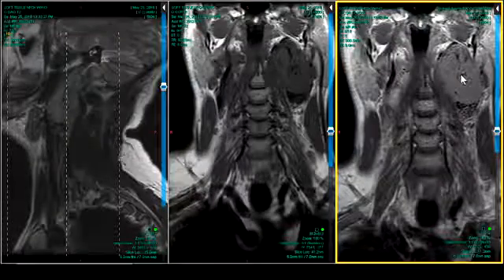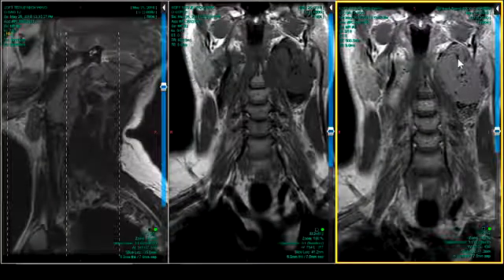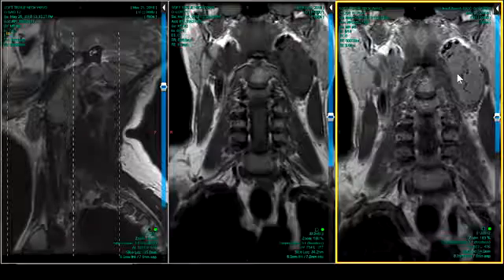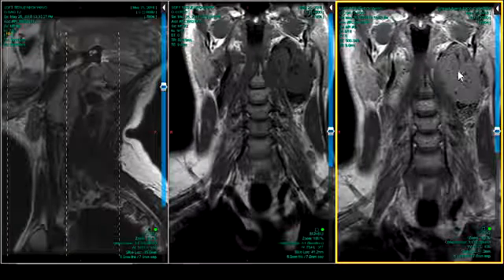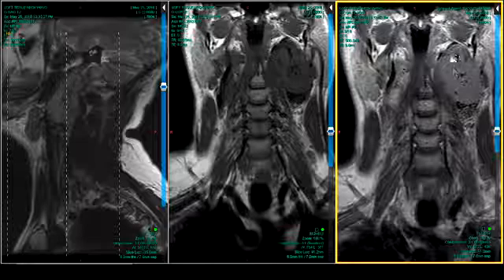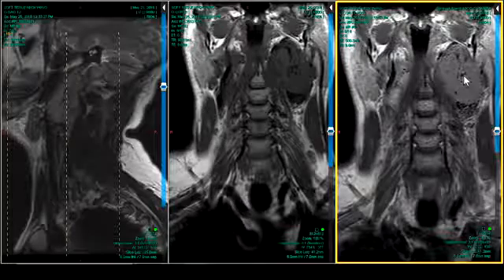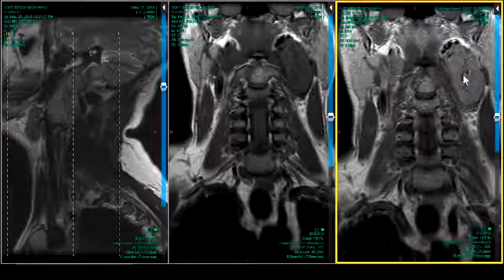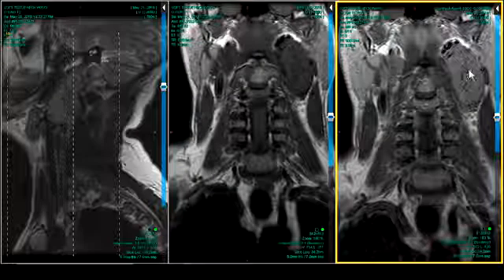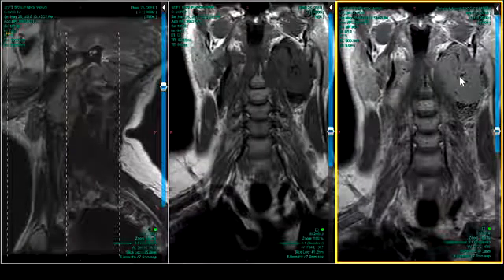Now, the differential would include calcium, but calcium isn't linear, at least not usually. Maybe in oligodendroglioma it's branching or linear, but not usually in most masses. Is something branching going to be calcium? You know, maybe an actinomycosis, you could have branching calcification. But other causes of hypointensity that you would consider, flow void, obviously, and there are some prominent vessels at the edge of this, but it does have a very circuitous internal character to it.